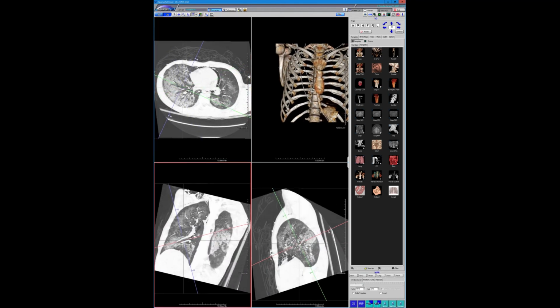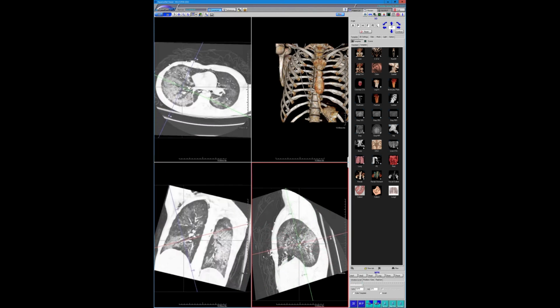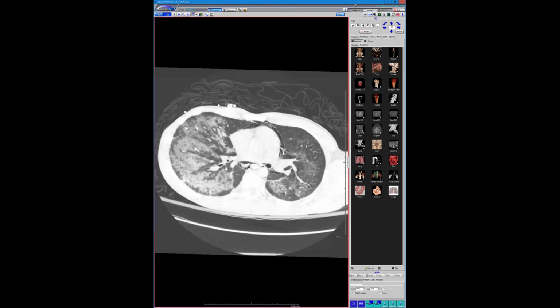I mean, really just gorgeous. One of the nicer cases I've seen with it. Central sparing, peribronchovascular or subpleural sparing, central sparing. And we came in the morning and one of my colleagues, don't even ask me why, did another CT like 6 hours later. Who knows what they were looking for.